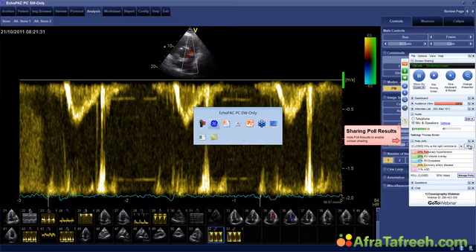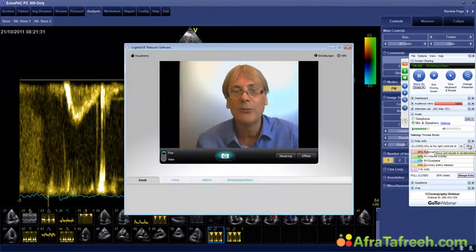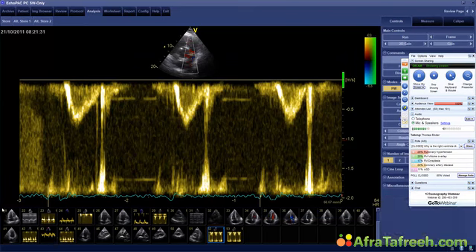Well, I will now give you the answer. Again, I'll show you the loops and I will go through the loops and I'll try to show you how I would approach this problem. And then you will see how easy in reality it is.